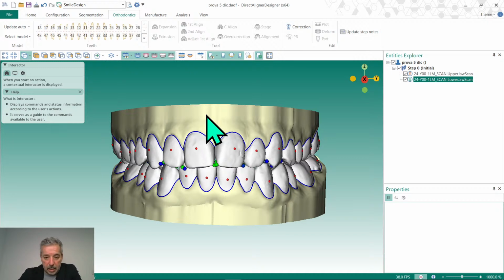Today we work in a free way, with no artificial intelligence, just the human mind, and we use just correction, just to change the position of the tooth in a different way. Because DIA software also uses a part of artificial intelligence to help you in some movements, you just add some detail and the artificial intelligence shows you a preview of the result of the planning.